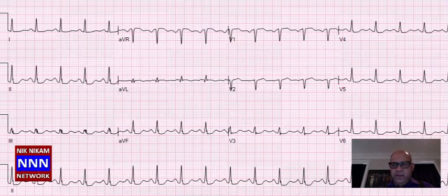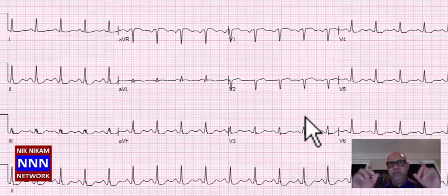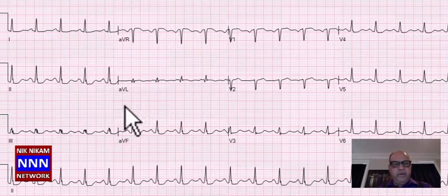So there are a lot of findings in this electrocardiogram. The moment you look at the electrocardiogram, it should look to you not as individual leads, but like a picture, just like as you see a picture of a human being on a magazine. So that's how you identify, oh, that is Rebecca, or that is Kim, or whoever it is. And this is a patient with anterior infarction with subendocardial ischemia.